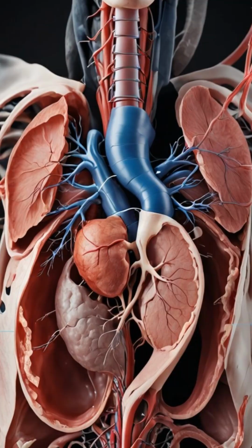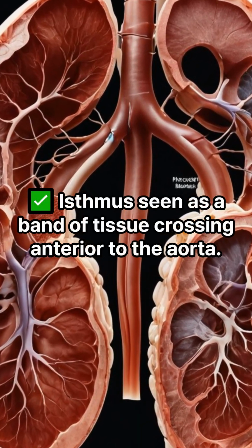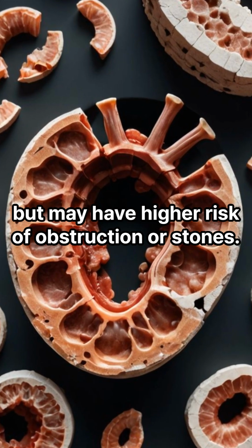Sonographic appearance. Fusion at midline lower poles. Isthmus seen as a band of tissue crossing anterior to the aorta. Normal renal function, but may have higher risk of obstruction or stones.